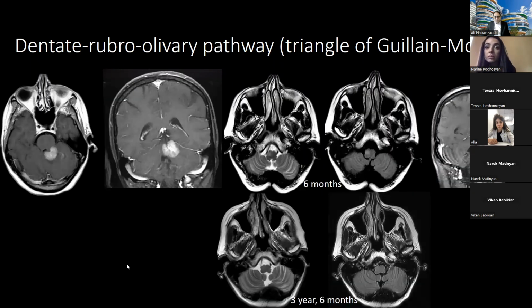You can see a patient that had a tumor involving the left cerebellum, also extending into the left superior cerebellar peduncle. After resection of the tumor, the patient developed hypertrophic olivary degeneration of the contralateral olive. You can see it's bright, it's a little bit expansile. So based on the anatomical location of the tumor, that can inform us that we're dealing with just a known pathway that happened because of anatomical tracts that have been damaged, and nothing needs to be done for this patient.